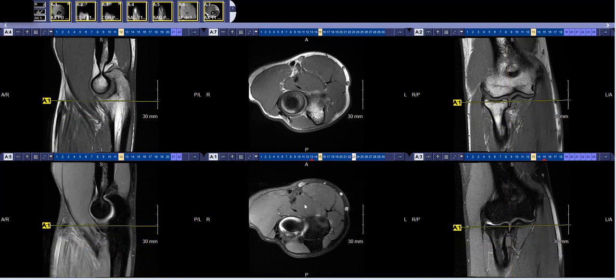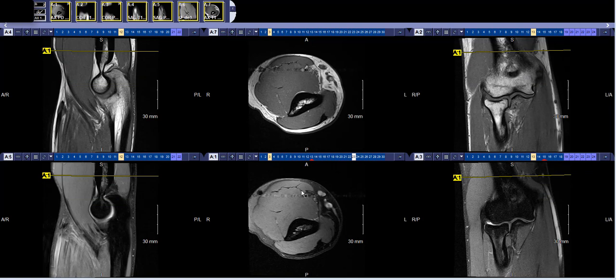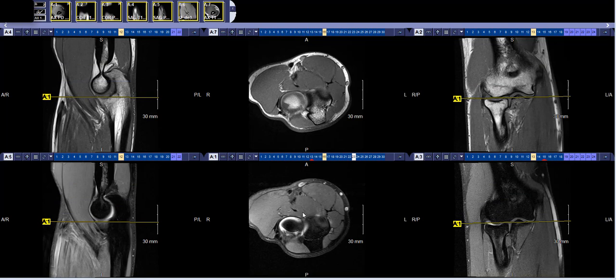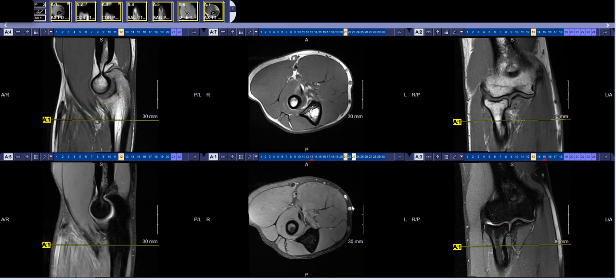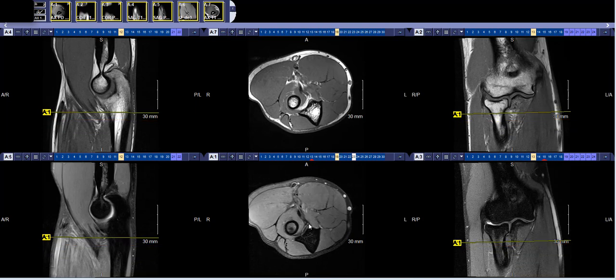The biceps, distally, there are 2 heads of the biceps tendon, a long and a short, or short and long head, which blend together to insert on the radial tuberosity. The long head is shorter and inserts first, and the short head goes further and is longer. That makes sense. That's how I try and remember things.